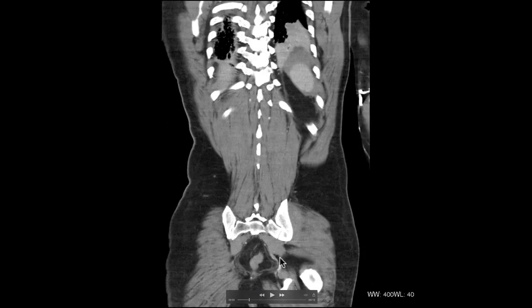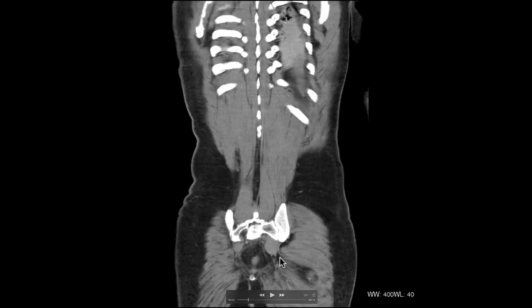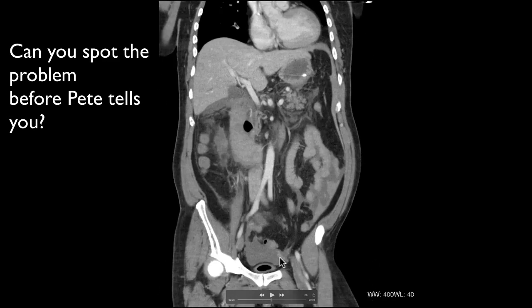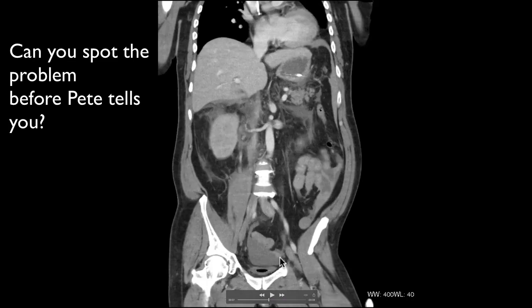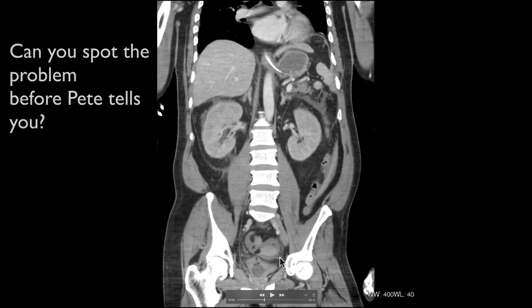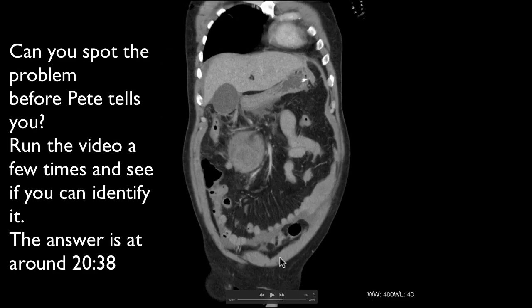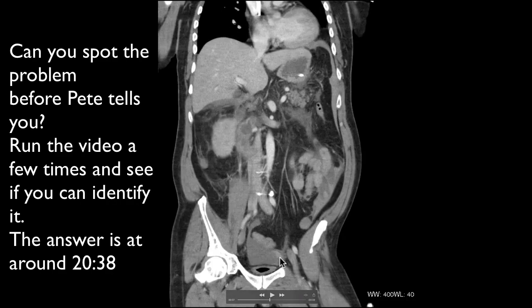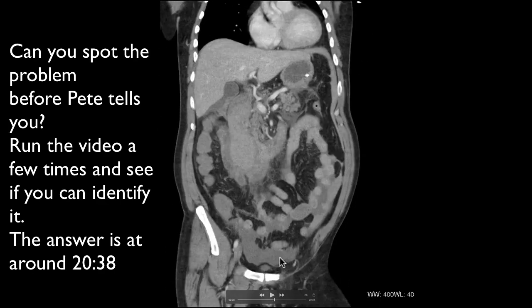So this is a patient who came in with acute pancreatitis and wasn't very well. A lot of abdominal pain, obviously, but also a drop in the haemoglobin, so we did a CT scan. There are obviously lots of different types of complication of pancreatitis you can see on CT. You can look for biliary dilatation, pancreatic necrosis, pseudocysts, other collections, inflammatory masses, that kind of thing. The other important thing to look for is vascular complications.